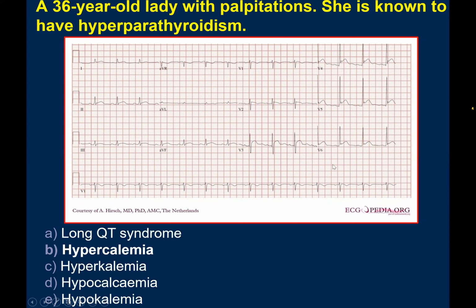It's not actually what I'm asking about, just that it is good to have you come across it. It's a young patient with these ECG changes, typically early repolarization, which is most of the time benign. There is now one condition, early repolarization syndrome, that could be malignant, but it is very rare, and there are case reports about it. But generally, in a young patient, you may see this concave type J point. There is a notch there. The T wave is upright. We call it early repolarization.